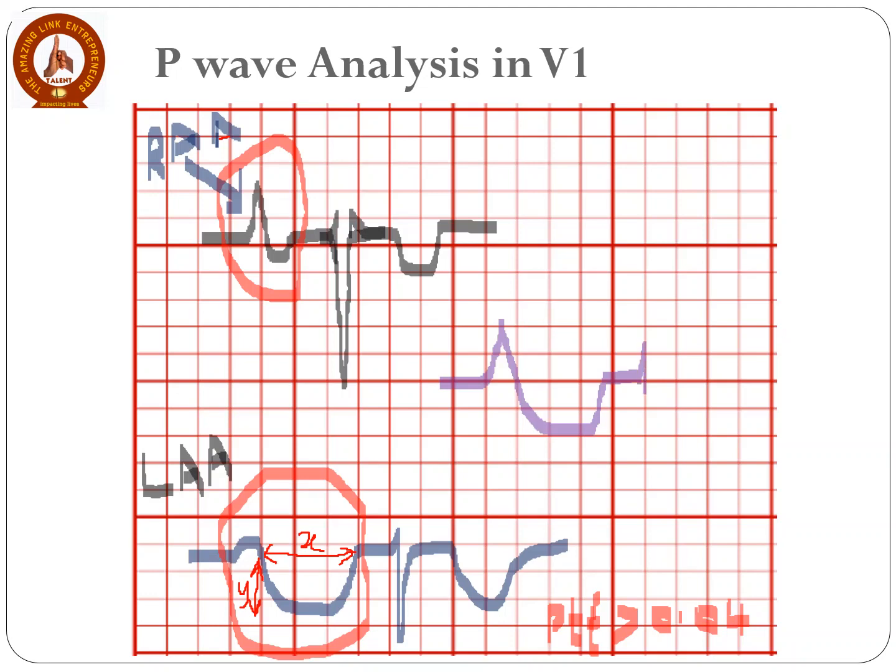This one is the QRS complex to contextualize it. The P wave is our focus here, on this biphasic P wave. Look, the initial component is peaked, then this second component is broad and deep, showing biatrial abnormality.